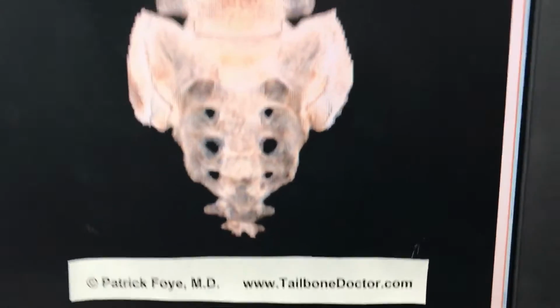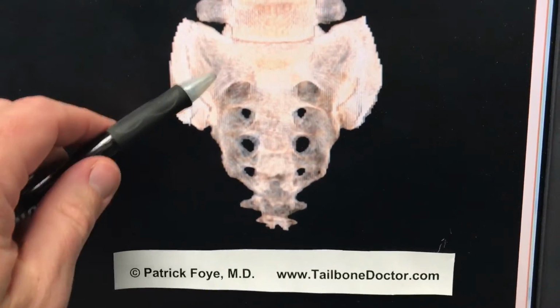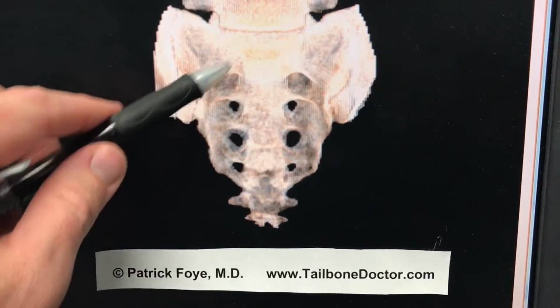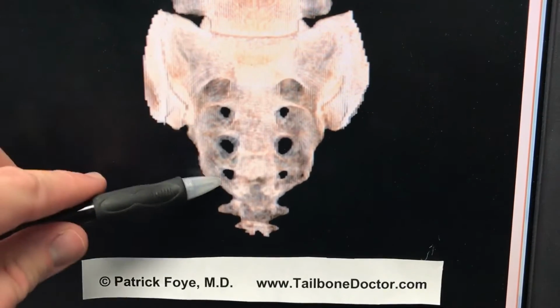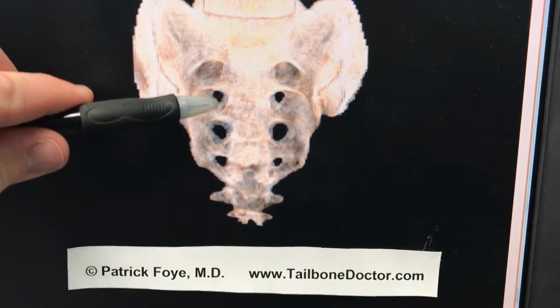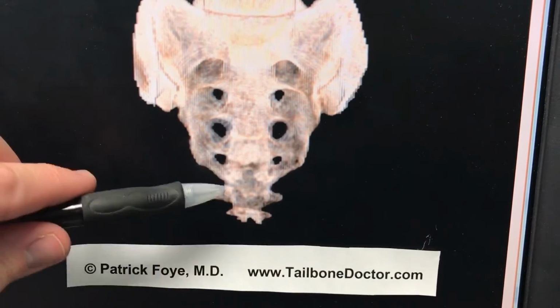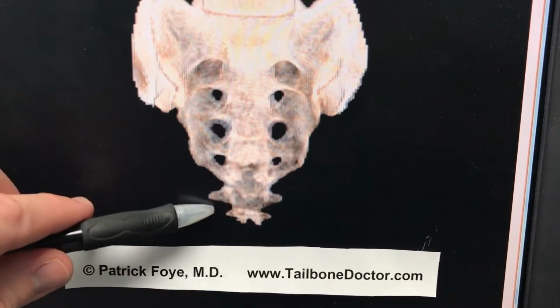So just to orient you on this image, this is the sacrum of this individual, from about here down to about here. The sacrum has these holes that you see in it. That's normal. These are the sacral foramina, which are the holes that the sacral nerves exit through. But then we get down to here, which is the coccyx or tailbone.